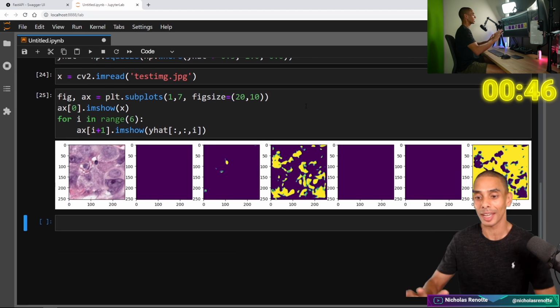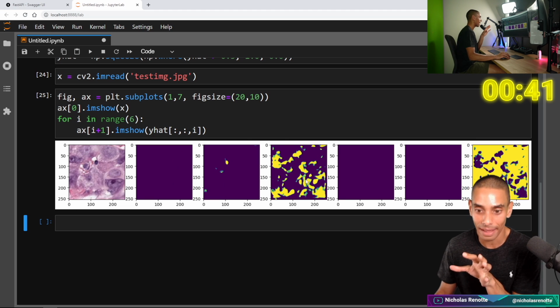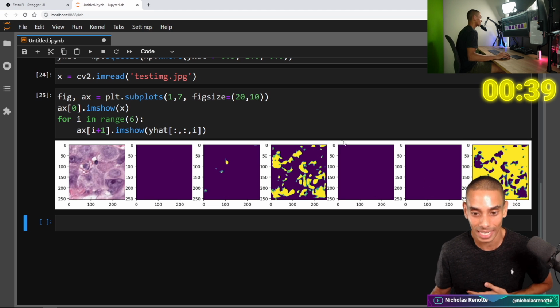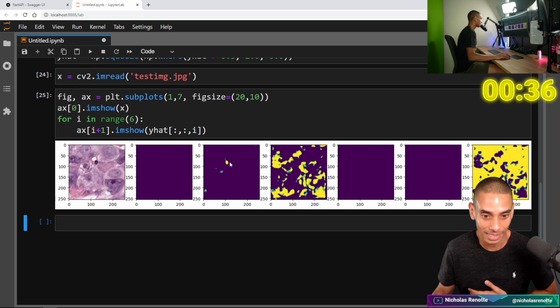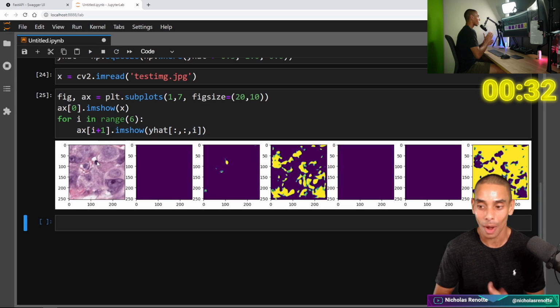We've got a medical image segmentation. So you can see that this is nice stuff that doesn't have cancer. These 5 classes here are cancer predictions. So you can see that it's predicting that these regions have cancer. This little black dot is obviously cancer right there. So we've actually been able to go and make those predictions.